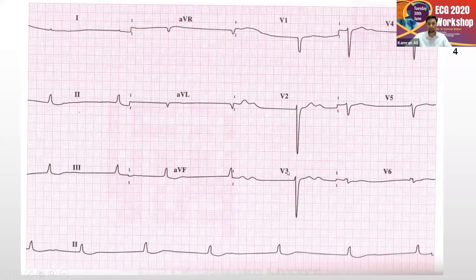Not really. So the QRS complex, T wave, and then there's a wave after that, and it's called a U wave. And you can see the ST segments are sagging down. These concave down ST segments with bradycardia and sinus arrest, no P wave. It's a junctional narrow complex escape rhythm going on. So this ECG is actually classic for digoxin toxicity.